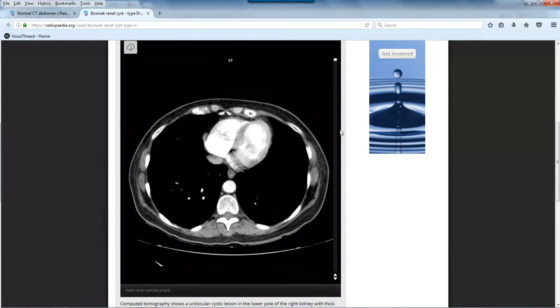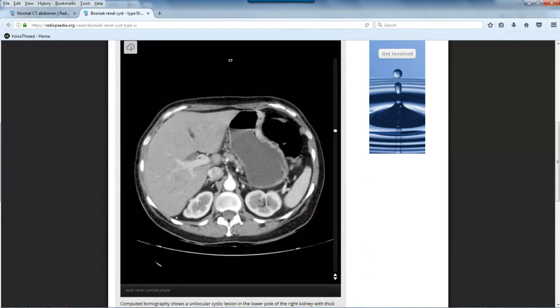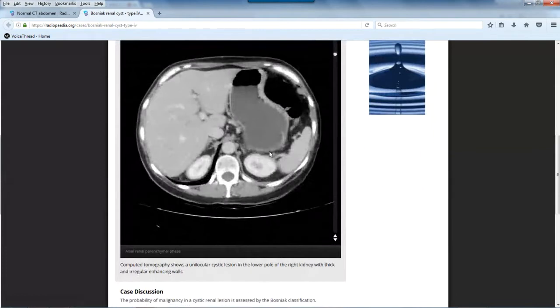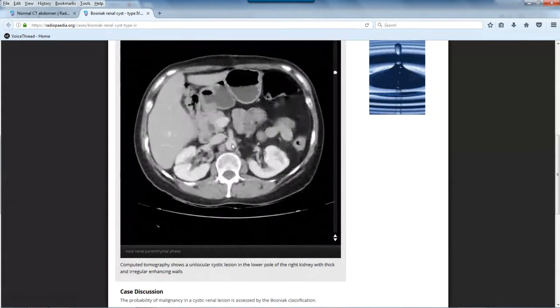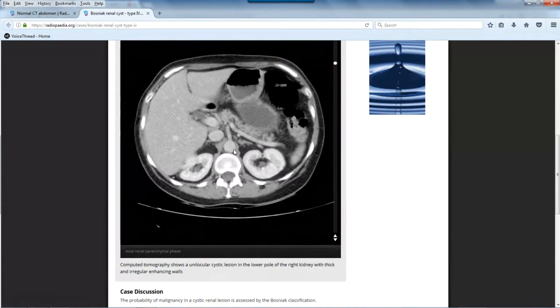All right, those are the main ones that I'm going to have you be able to see on a CAT scan. So now we can move over to the inferior vena cava, which is a little bit harder. Vascular system is a little bit tougher to see. Let's see if we can switch over to our parenchymal phase, which is more of a delayed phase. So you can see how I still have kind of grayed out in the aorta, but the inferior vena cava is essentially the same opacification. So we're a little bit delayed. That means that the contrast has circulated all the way through the arterial and the venous system, and it's now traveling back through the venous system. So the aorta and the inferior vena cava essentially look the same.